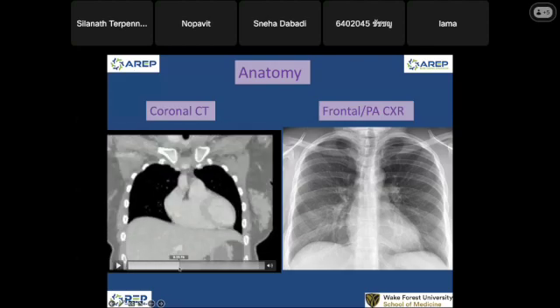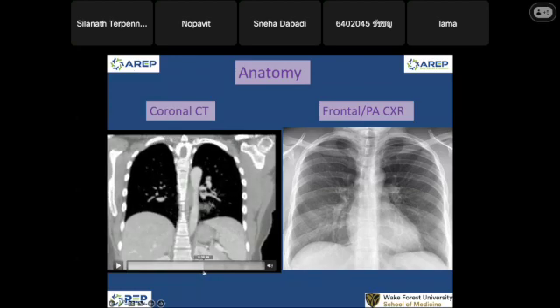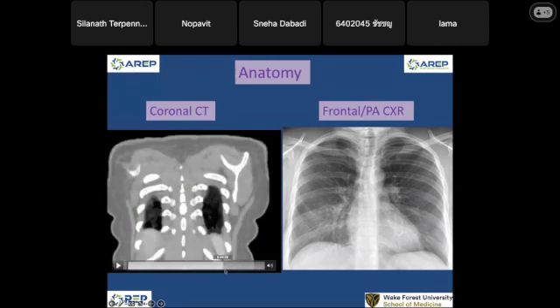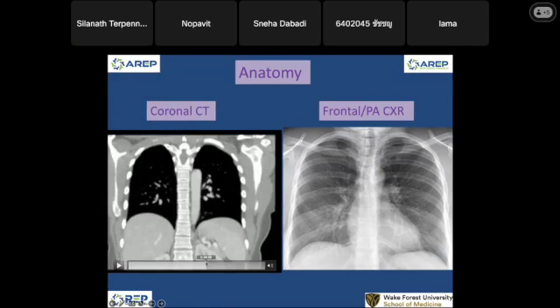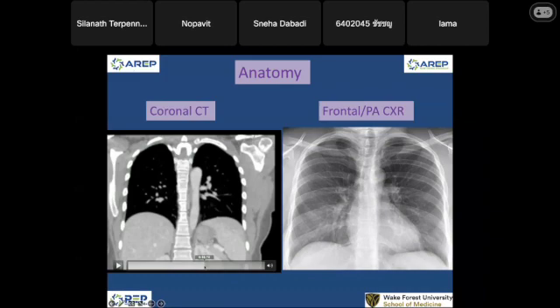Okay, I'm going to go further. We start seeing the spine. This is my thoracic spine here, and this little guy is the spinous process, and from the joint with the ribs is the posterior rib. Okay, and you see your scapula here, and the glenoid fossa, and then the humeral head, right and left are the same. You see all of the rotator cuff muscles here as well.